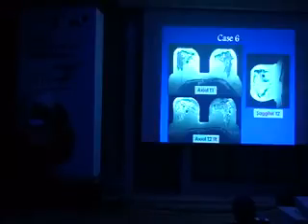So this patient, if she is a gene carrier, the justification to do an MRI is valid. One of those high-risk patients also is the one who was treated by radiotherapy, for example, for Hodgkin disease of the mediastinal lymph nodes. These are now considered high risk. So, what are we seeing in the MRI? A mass, right? A mass with a border. But look at the signal intensity. I'm providing you with the axial T1, the axial inversion recovery images, and the sagittal T2.